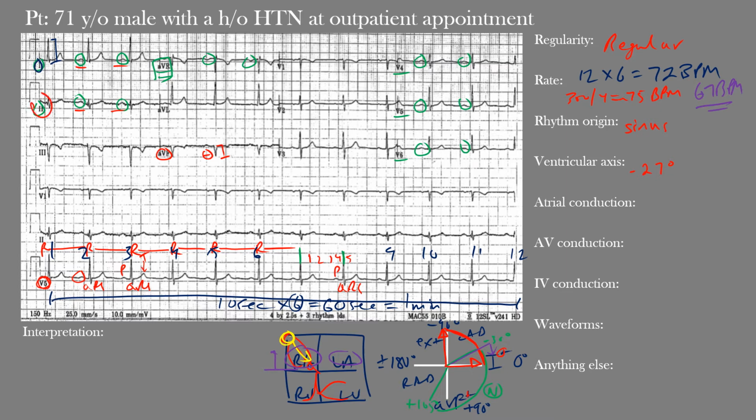In this case we look at lead 2. Where is lead 2 normally placed? Lead 2 is right here, at positive 60 degrees. The perpendicular of lead 2 comes right here, which is that negative 30 degrees. That means if lead 2 is positive, it will put us towards the positive end of lead 2, in this region here. If lead 2 was negative, it would put us over here, in this pathological leftward shift region.